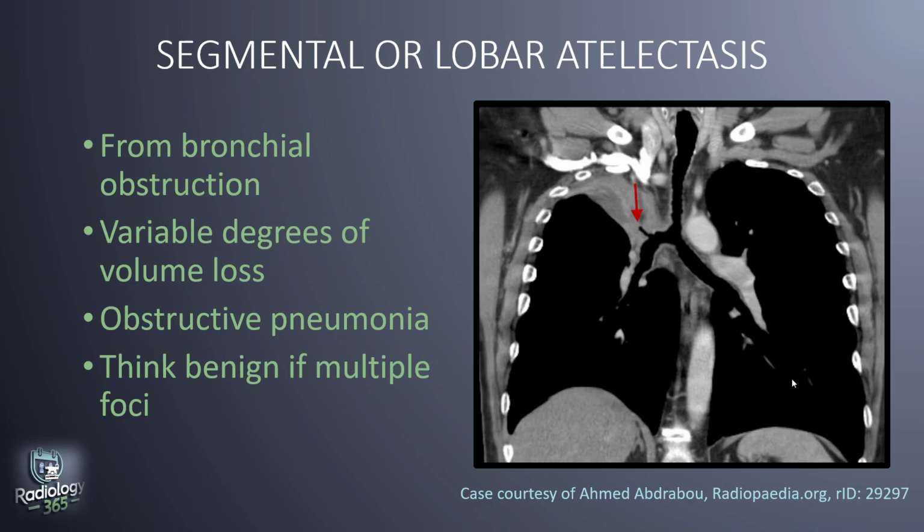Now, atelectasis is due to bronchial obstruction, and it's a very common presentation of lung cancer. Despite the presence of atelectasis, volume loss, which is usually the case in cases of atelectasis, is variable, and this variability of volume loss is due to the volume displacing effects of cells, because cancer is a growth of cells. So even though the lungs may collapse, you may have the cancer cells adding volume to the thoracic space. You may have excess mucus plugging, you may have excess fluid, and all those things may prevent you from seeing the effects of volume loss per se.